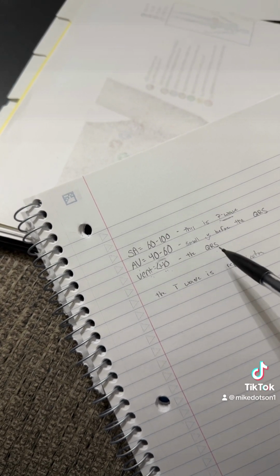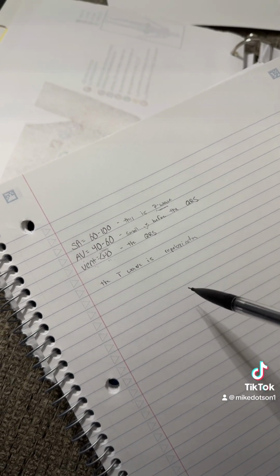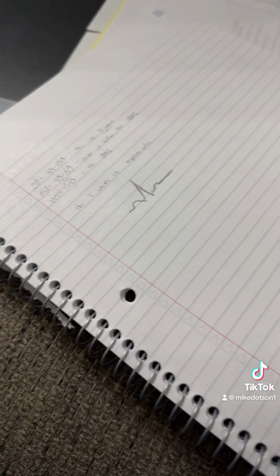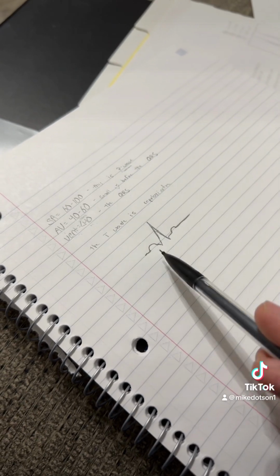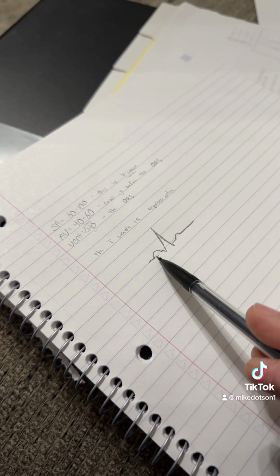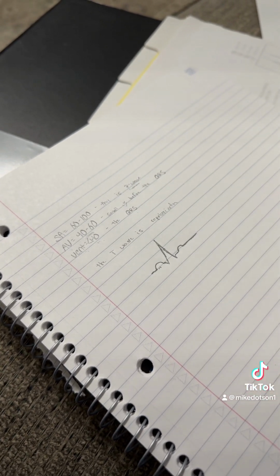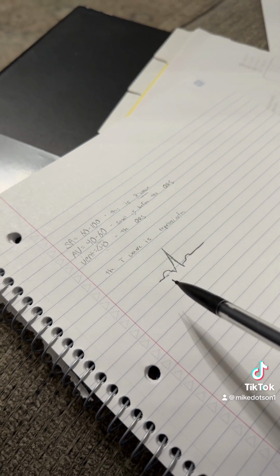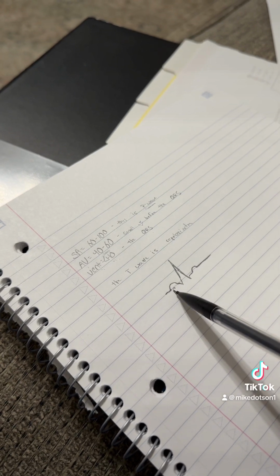This is the QRS. The T wave is the repolarization of the cells when they're recovering from the beat and getting ready for the next beat. Okay, the easiest way to remember the rhythm, what it could be, is there a P wave? If there's a P wave, then you automatically know it's coming from the SA node. It could be AFib, it could be A flutter, could be all kinds of other stuff we'll get into in a second. But you know if there's a P wave that it is coming from the SA node.